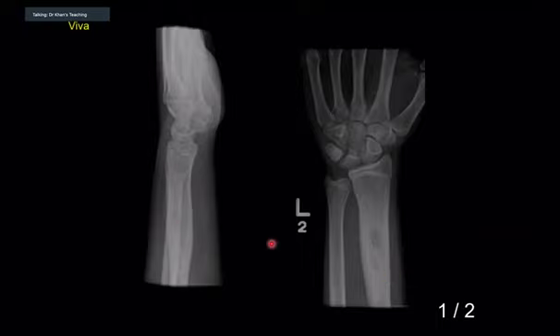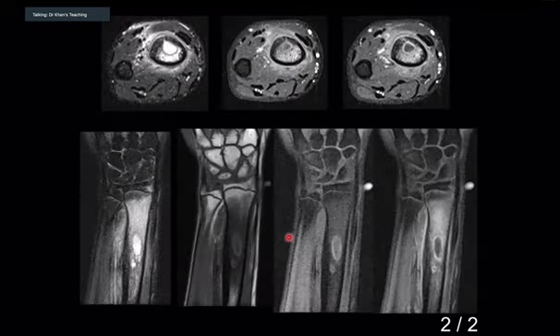Now, candidate 1, I'm showing you the MR of this patient. I am going to point out, and you tell me what sequence is what. Let me give you a hint: it's better to look at the carpal bones on this one. What do you think this sequence is? T1.